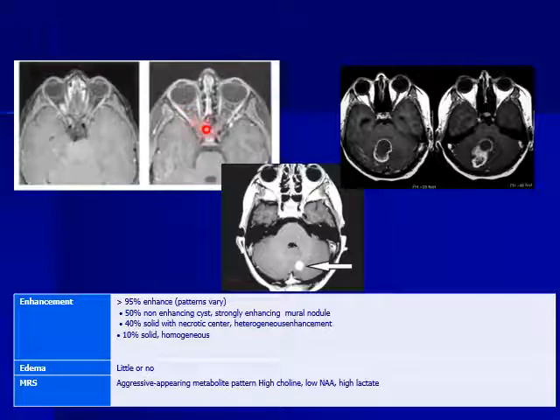You can see it as the italic letter I appearance, okay, due to enlargement of the CSF spaces also around the optic nerve. And this is the most serious appearance that makes a lot of conflict, when the tumor gets central necrosis simulating glioblastoma multiforme.